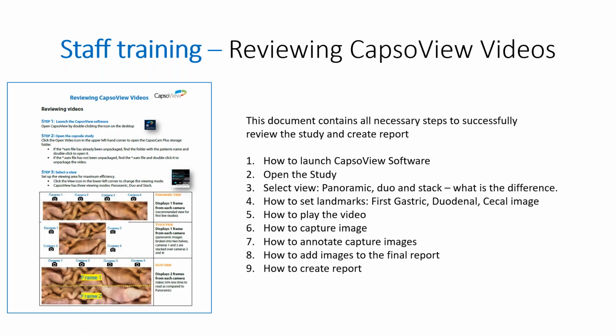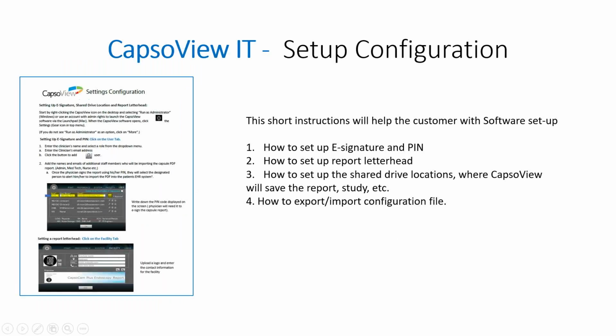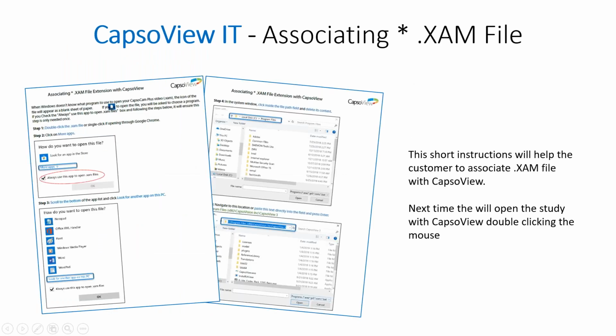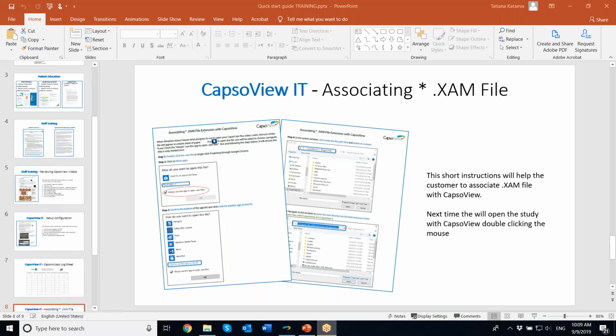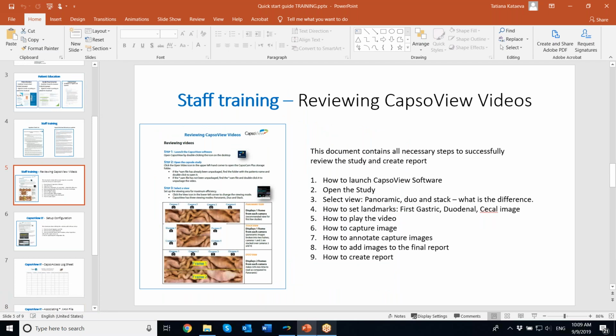I thought it's going to be really good for you to look through it with me on the actual software. So we will now move to the software and I will show you step by step how this document is really easy and valuable for the patient, for the customer, because that's kind of a great cheat sheet. It has all necessary steps of every process. It's short, has all details.